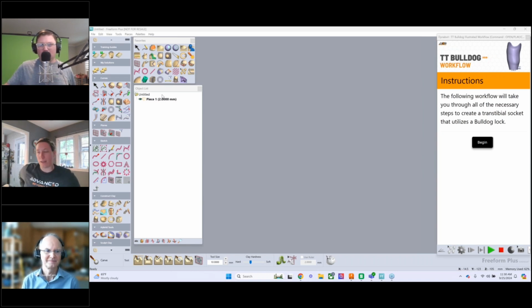I'm Katie. I have been working with Brent since February. Prior to that, I was using Meshmixer and Fusion 360, and all the same things Brent said: it's not that you can't do it, it's at what cost to your time can you do it. So it's been really fun working in Freeform. It's a lot more intuitive and it likes organic shapes, versus the nightmare of just getting an error message in Fusion. But what I'm going to show today is, as Kevin called it, a scripted path.